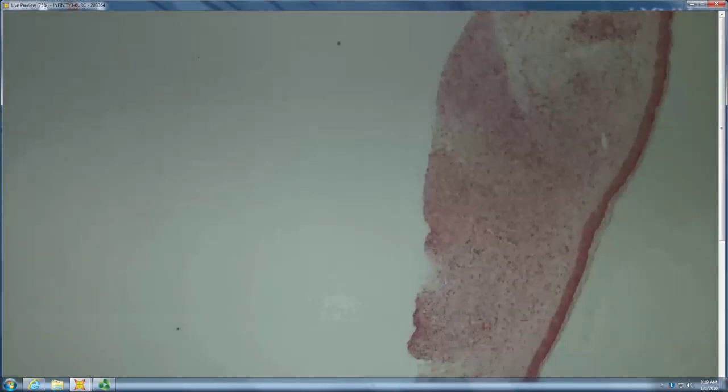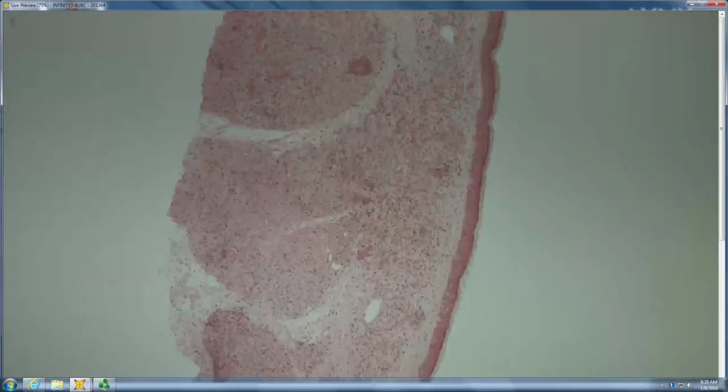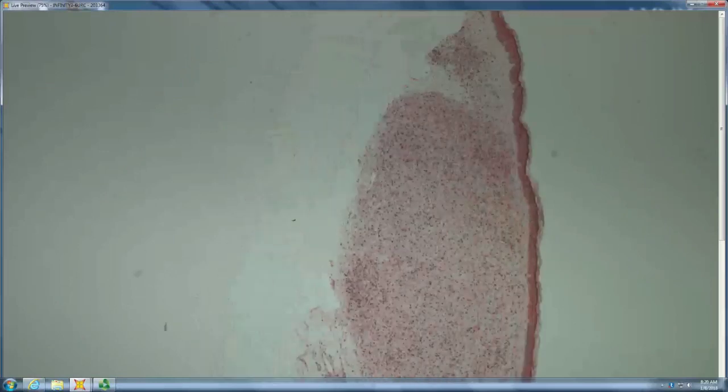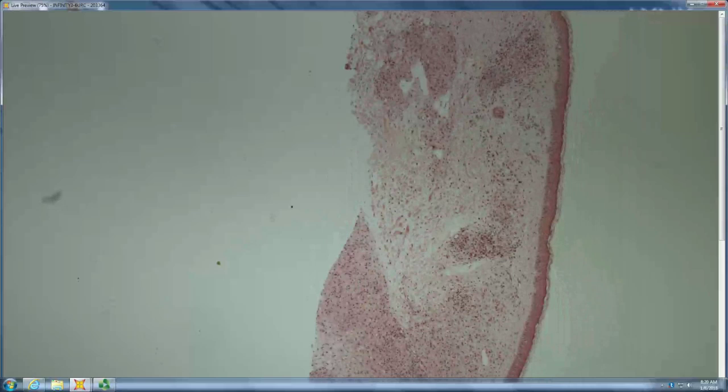And then, can't you get lymphs with extra cytoplasm? Can you find some of those? Endothelial swelling and lymphs with lots of cytoplasm are very typical things which have not been prominent in the examples we've seen, but they can be very prominent and sometimes the only thing you see. Yeah, interstitial infiltrate here. Thank you for pointing those things out because they're important.